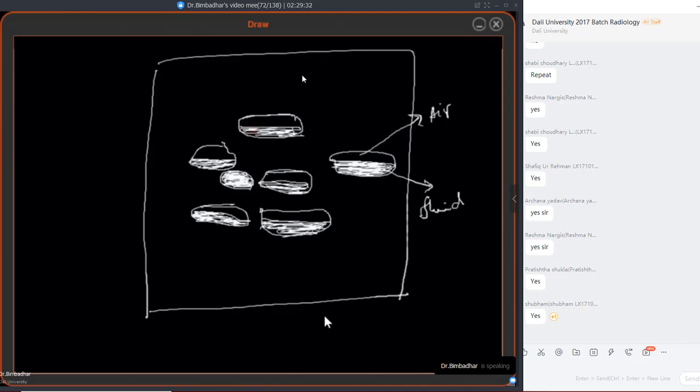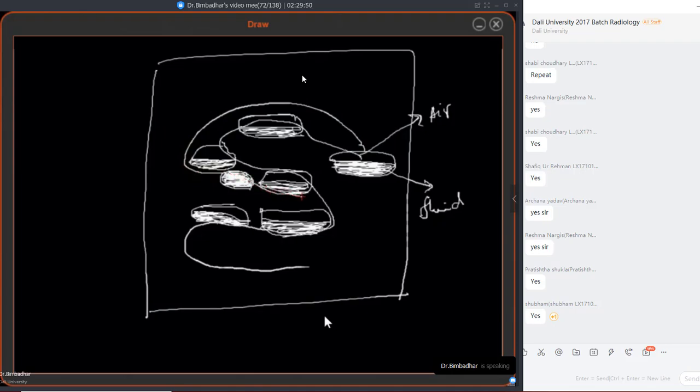So let us make out the continuation of the intestine right now. You see here the intestine is coming out like this. The loop is actually going out like this. Can you appreciate it? You see here, this is the thing like this. So this is how it is. Did you understand where I am looking? So the obstruction is present in this area. Got it? Is this point clear for you guys? Yes, no?